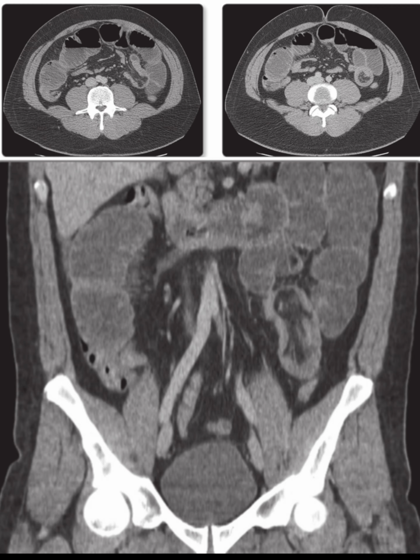causing obstruction. In this case, we are dealing with an ilio-ileal intussusception, as evidenced by the location in the small bowel. Now, in adults, intussusception is typically associated with a lead point, which is often a benign or malignant tumor. Here, the patient's high-grade small bowel obstruction strongly suggests that surgical intervention will be necessary, even though we can't clearly identify a specific lesion on these images.